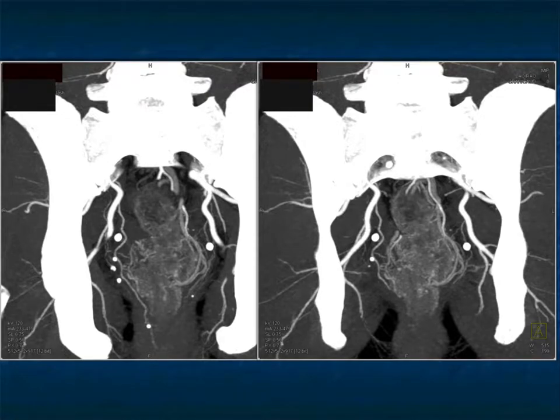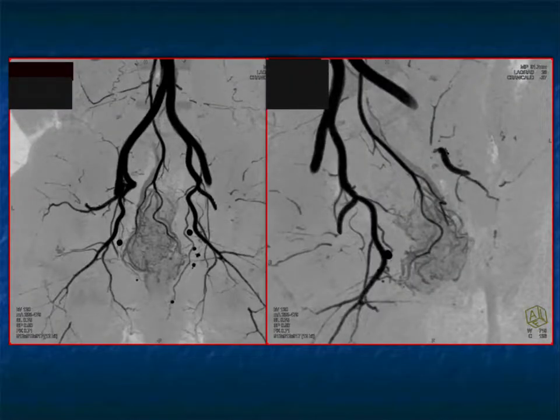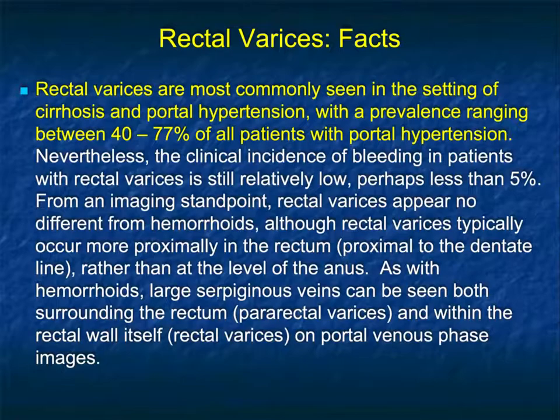So this rectal bleeding with the diffuse enhancement, classic appearance of a patient with varices at times. Varices, the vessels are often large, but again, a very nice appearance showing you with bone removal how good we can do in creating maps, be it on the sagittal MIP or the coronal MIP images. And you can also do negative display since some surgeons like that, and it can be helpful showing you, as in this case, the irregular vessels in the lower portion of the rectum.